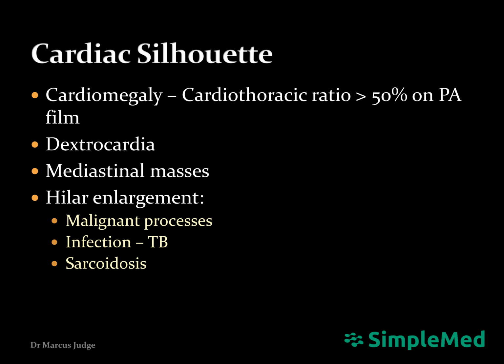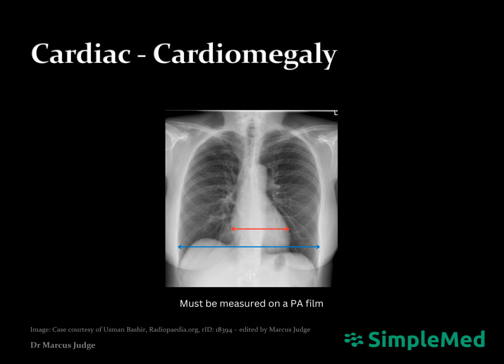As part of C, we assess the cardiac silhouette. Primarily, the size of the heart is of most importance. However, incidental findings and assessment of the hilar lymph nodes can alter management dramatically. The cardiothoracic ratio can be used to identify an enlargement of the heart borders, which is most commonly from cardiomegaly, but can be due to other processes such as pericardial effusion.